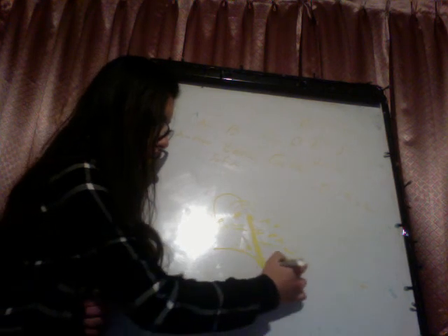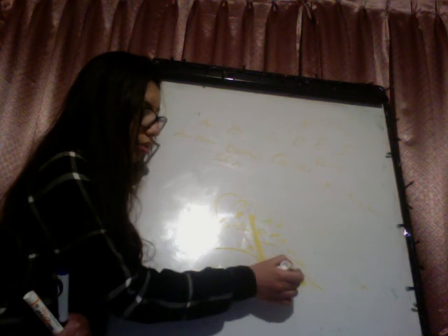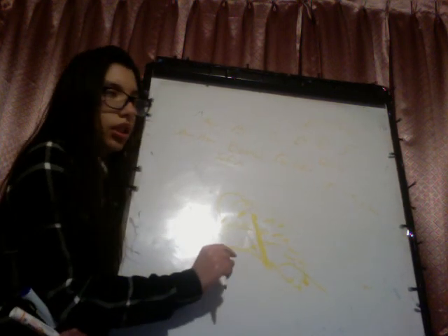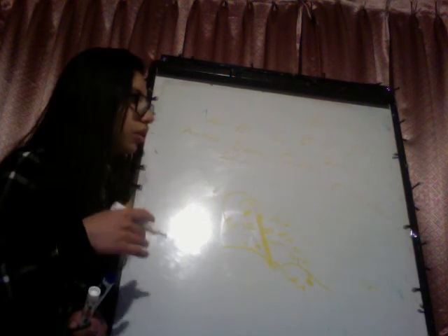Next, the diaphragm should be like this, and we could see a gastric bubble. We should measure the distance because sometimes we could see increased distance, and this could indicate or suggest some pathology that we will see more on.